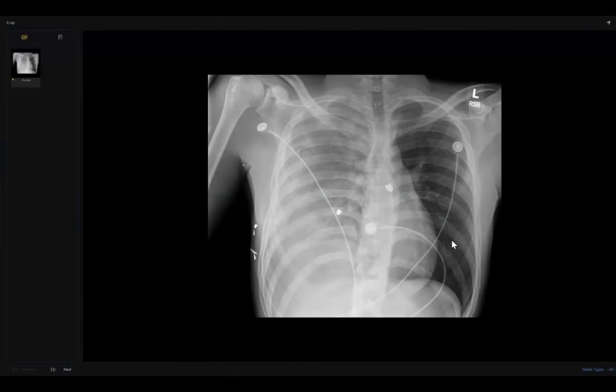You mentioned here the mediastinum is central, not acceptable at all. The mediastinum has a contralateral shift. Next, you mentioned there are two opacities which may be contrast. No, not contrast at all. I didn't say contrast. I said radiopaque objects that could be gunshots.